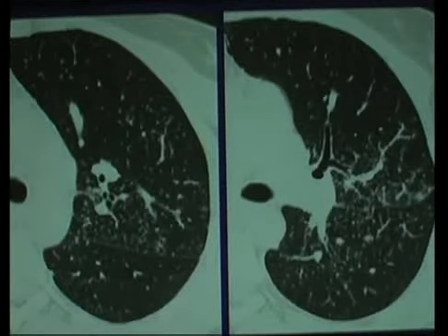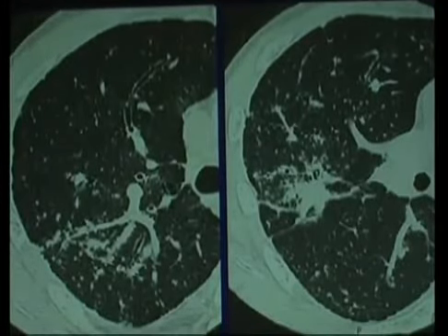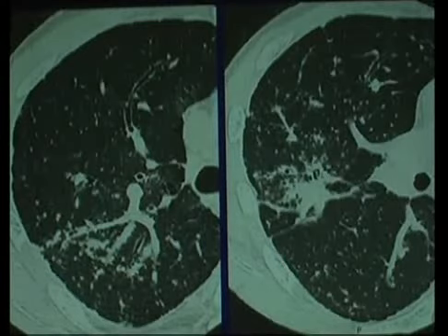And the same thing is true for us. Look carefully along the axial interstitium. You don't need much more than this one area right in here to make a diagnosis of sarcoid. Again, the same thing. These are all basically the same pattern of nodules, perilymphatic in distribution, clustered.